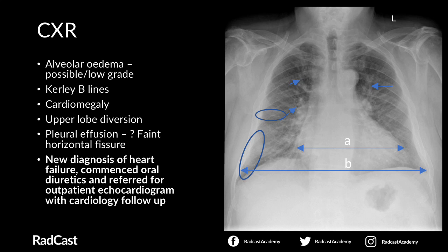And here is the X-ray back. So let's use the A to E approach to evaluate this chest X-ray, but in order this time. So, is there any alveolar edema? Well, I'm looking at both of the hila here in the chest X-ray and assessing outwards on both sides. I'd argue that I can't really see any overt opacities here to suggest edema, but I'm pretty sure I can see an air bronchogram which I've arrowed. This might suggest some low-grade alveolar edema here.